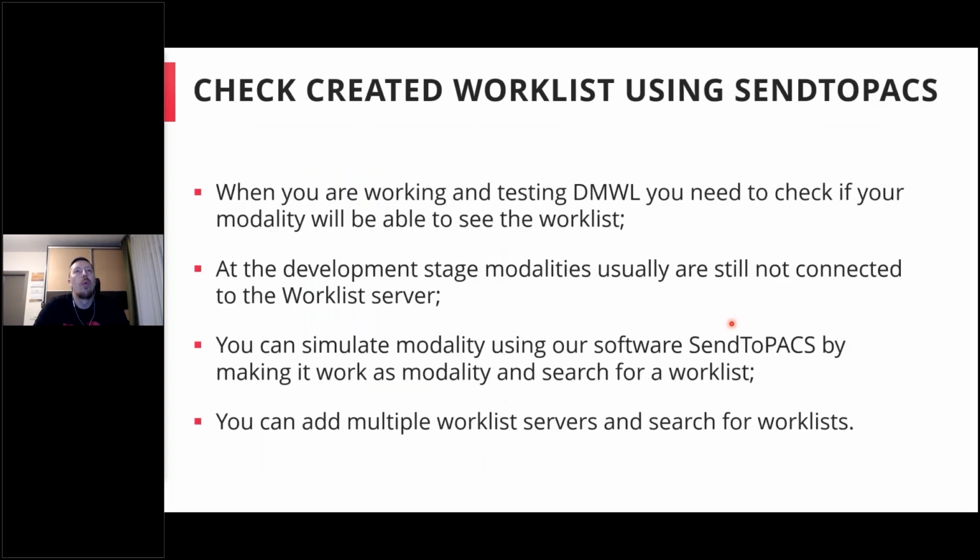And when you are working with such worklist functionalities, usually you are developing on your test environment, and usually the modalities or devices are not connected to the actual PACS or worklist server. So it's sometimes hard for you to tell if the worklist is created correctly and if it's showing all the information.